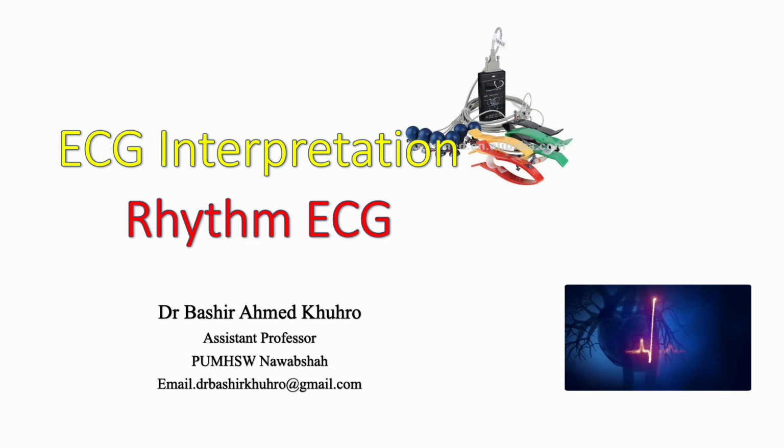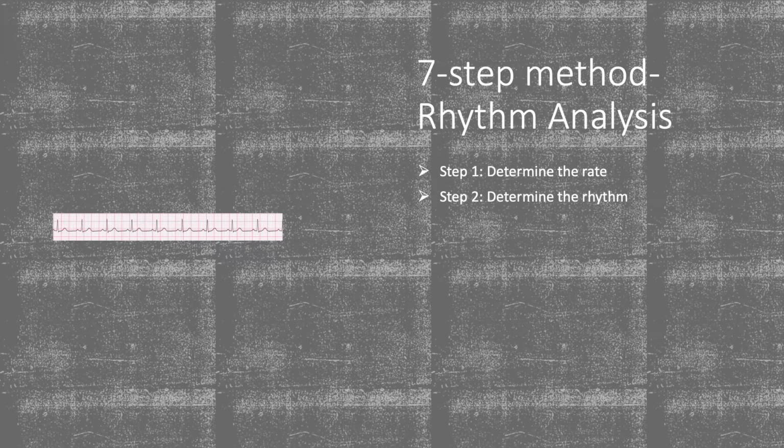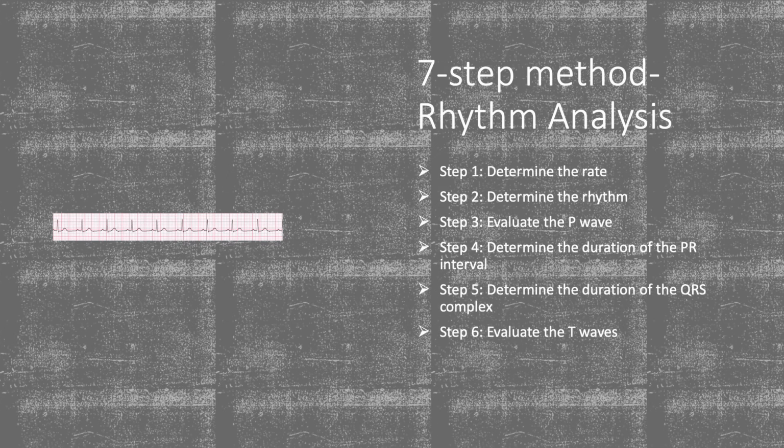Bismillahirrahmanirrahim. So this is the third lecture, and this third lecture will be on rhythm ECG analysis. For the rhythm ECG analysis, we have the 7-step method, and these are the steps. You should read the ECG one by one, with every step included. So let's discuss the steps one by one.